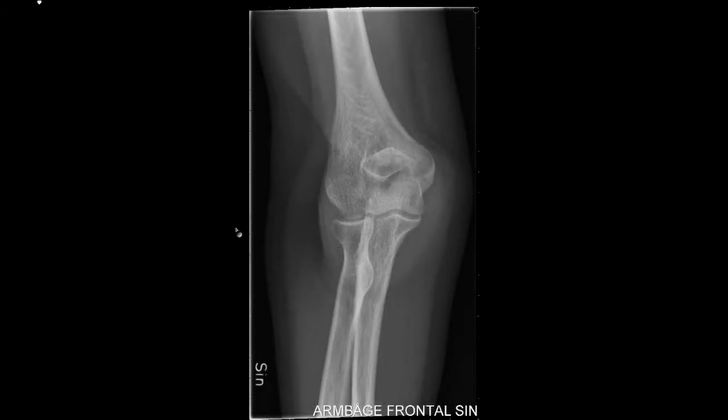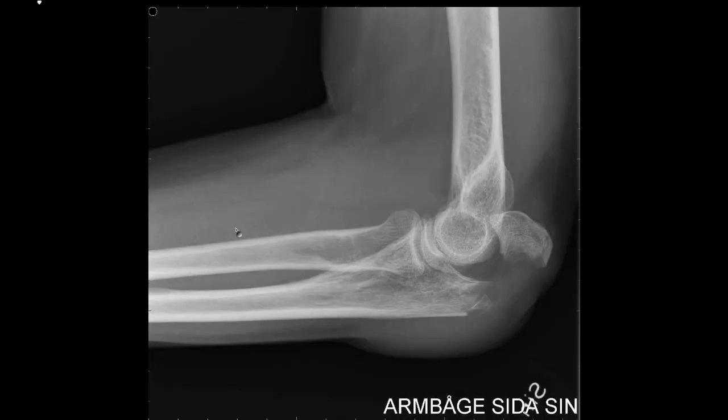So next fracture is this one. Do you see anything obvious? Well, maybe not here, but if you look on this one, then there is, boom, a big fracture here. The olecranon tip has been pushed dorsally. No big deal, just describe what you see.